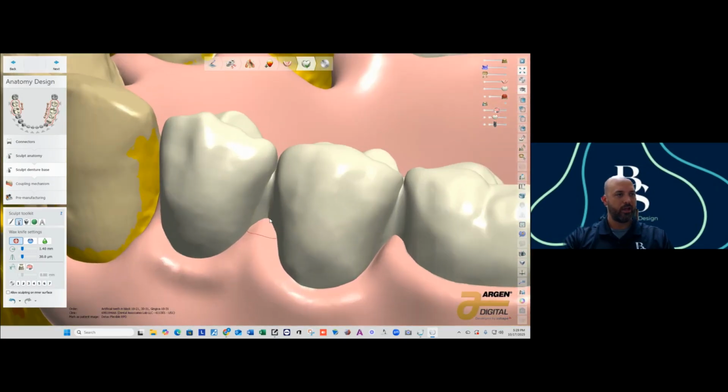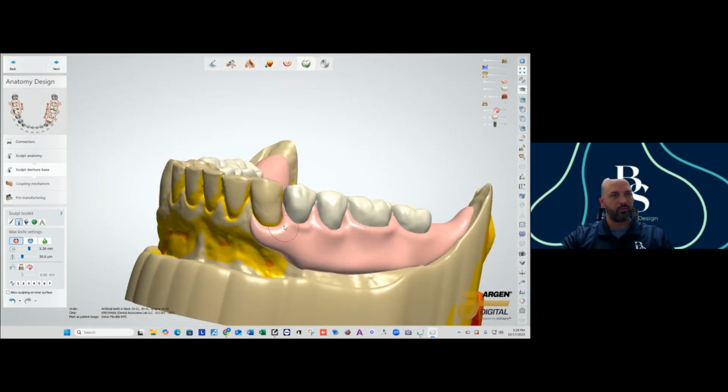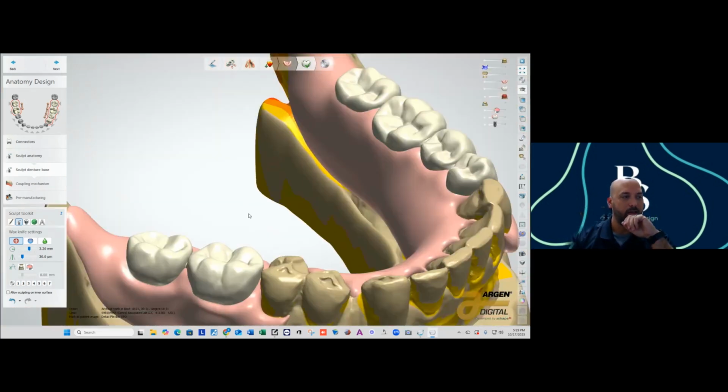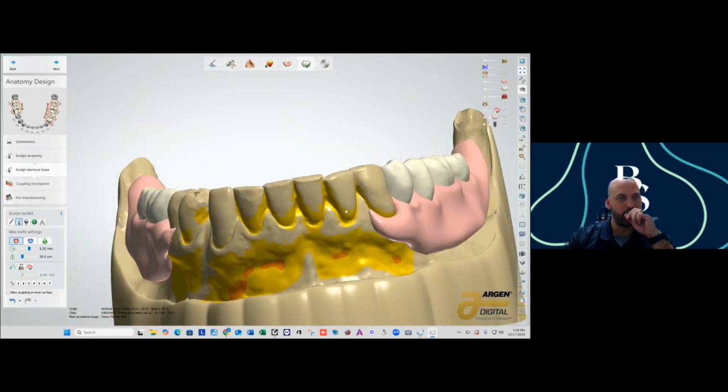And then I'm also going to go in here. I like to add up the papillas a little because when it cuts the pockets, it's going to cut these papillas down quite a bit. And I want to make sure that I have a place for my bonding agent to run up the pocket and fill those papillas in so that I don't see these bridge connectors in between the teeth.